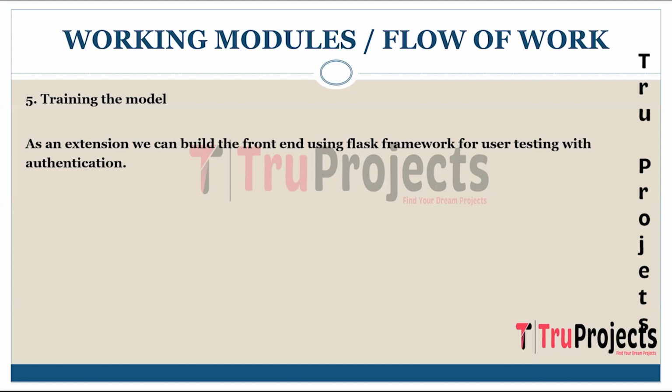As an extension, we have built a front-end using the Flask framework for user testing and authentication. Coming to the Flask framework, the Flask web framework is employed to create a user-friendly web-based interface for the project. This interface serves as a portal for user interactions, allowing users to upload their retinal images and obtain diagnostic results.